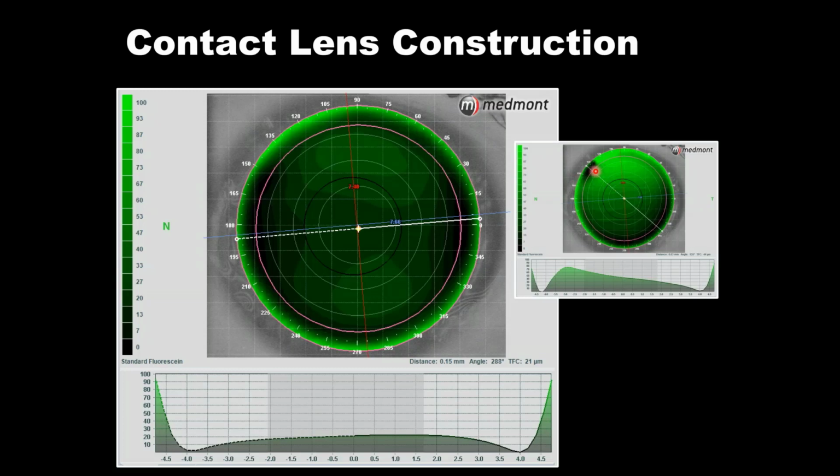I'm sure you can imagine how valuable this tool can be when we're using the contact lens software. Now, one of the considerations that you need to be aware of is that the editing option can only be used with a single topography. It can't be used with the composite capture. So if you're dealing with a single topography that has error, edit that first before making your composite.